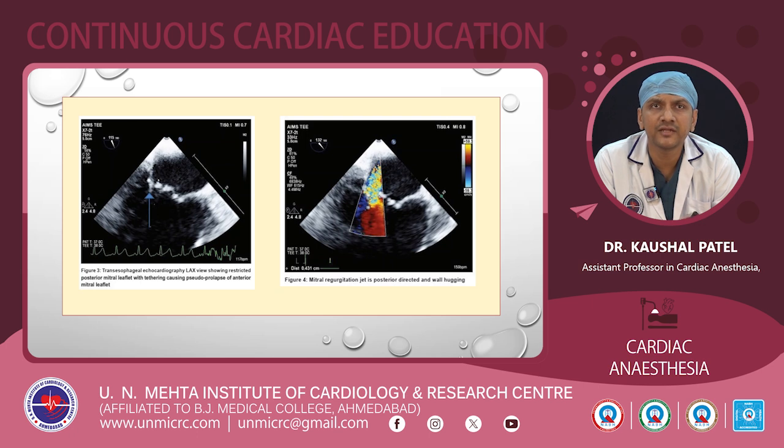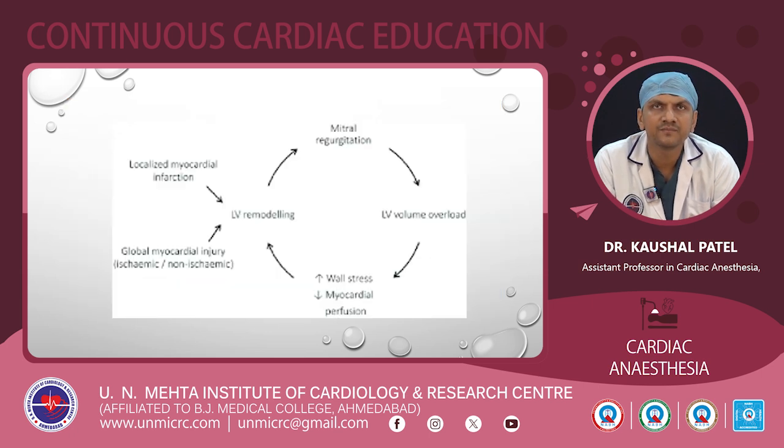This is the slide showing the Seagull sign, in which the transesophageal long axis view shows the posterior mitral leaflet tethering, causing pseudo-prolapse of the anterior mitral leaflet, because the anterior mitral leaflet has to reach the posterior mitral leaflet for adequate closing of the mitral valve, producing the Seagull sign.